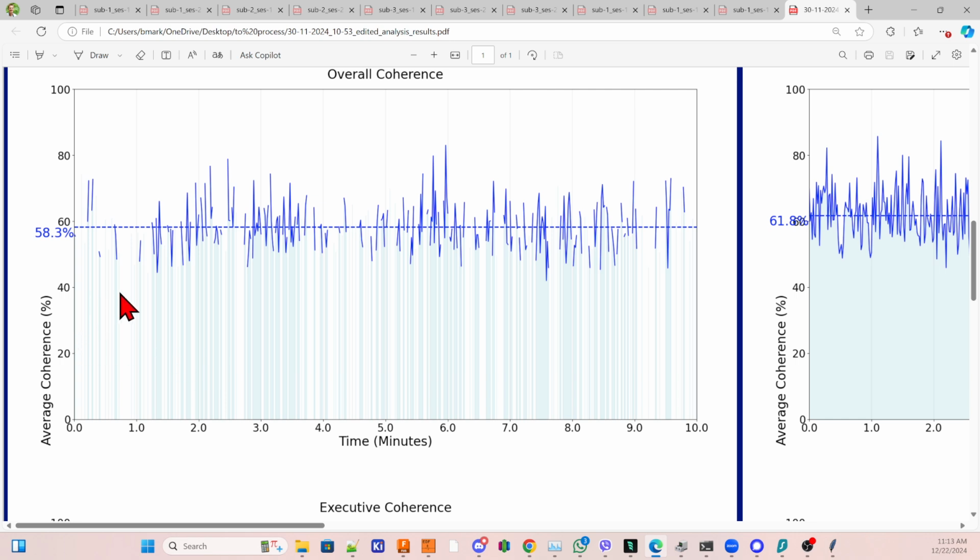You can see here every time, so this is the whole timeline. So we have 10 minutes, 600 seconds. And whenever there's an eye blink, that period of data is masked by the artifact annotation and is left out of consideration for generating this report. And so we can see here it's a lot of eye blinks.